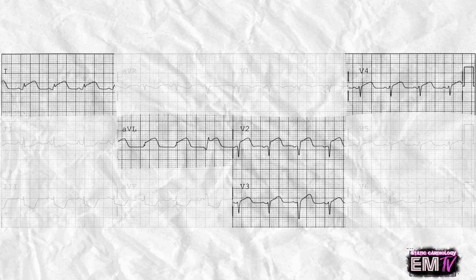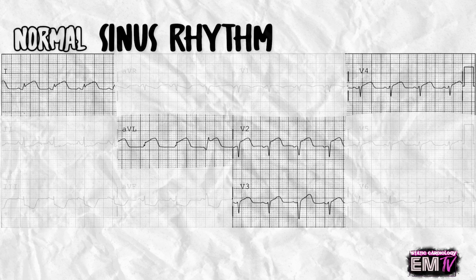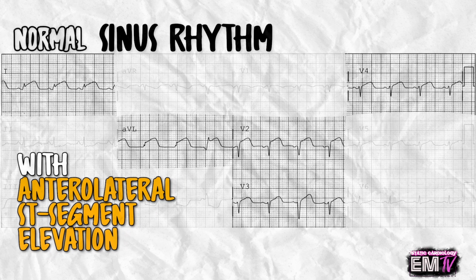My updated diagnosis of this rhythm is a normal sinus rhythm with anterolateral ST segment elevation. Now, let's go ahead and take a look at the scenario.